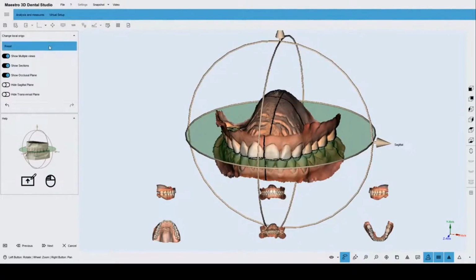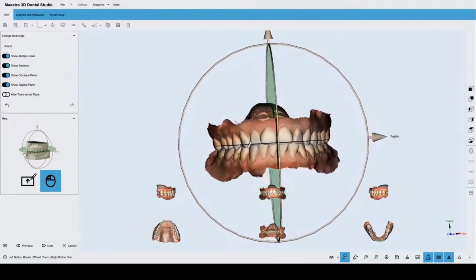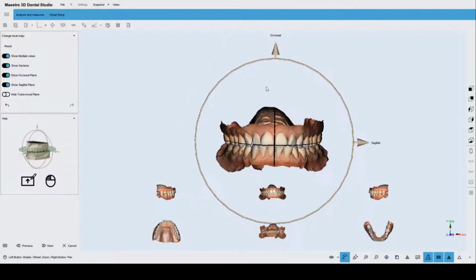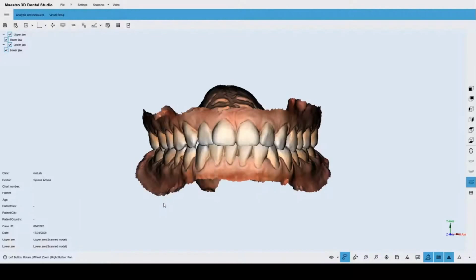available on the screen. You can see here that we can also show or hide other graphical elements in order to better evaluate the positioning of the models. This step is really important because everything we will do in the upcoming steps will be made according to the axis defined here. Supposing that we are happy with the positioning, we can proceed and start now the job. It's the real job, let me say in this way.